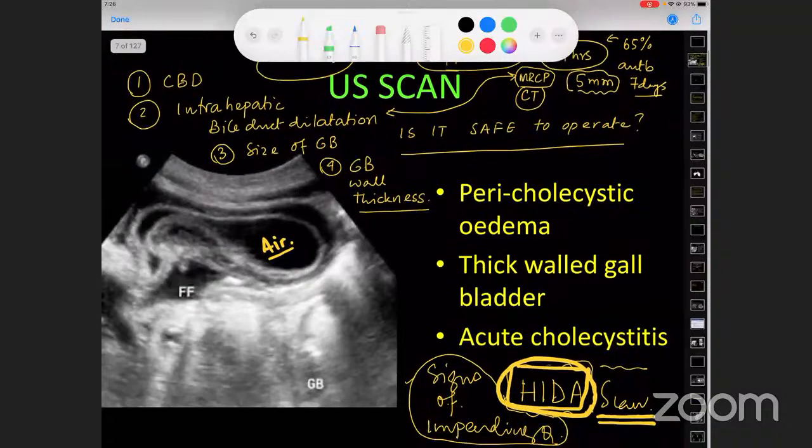Acute acalculous cholecystitis is a much rarer entity in an intensive care setup, which again becomes a very difficult thing to diagnose. But thanks to the bedside ultrasound, our experience has been very few, only 3 cases over these many years. To diagnose it in a patient with multiple other coexisting medical and surgical problems becomes a nightmare. Even if these patients are stable, believe me, you will not like to take the patient to nuclear medicine to have a HIDA scan, and ultrasound does a good job to diagnose.